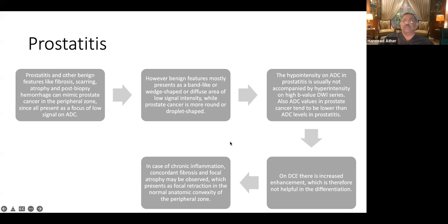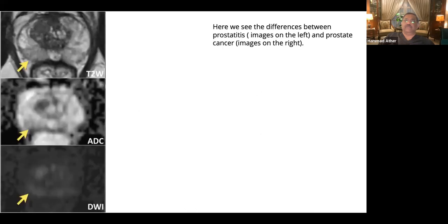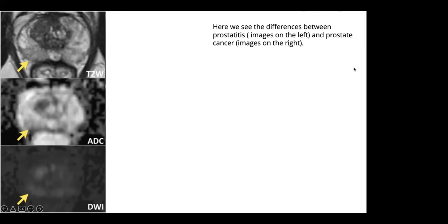As Basit explained, there are very clear features which separate cancer from prostatitis. This slide will help the audience better understand the two.